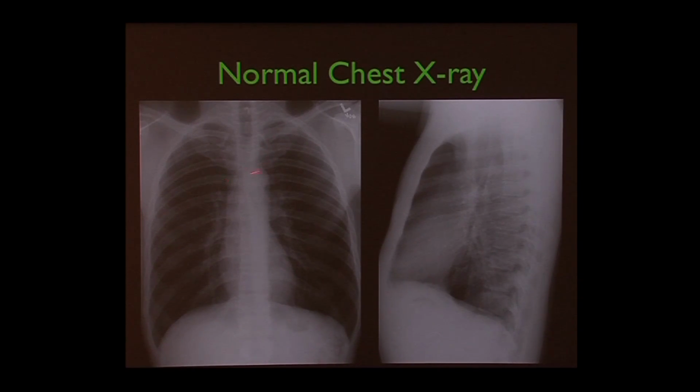We look at the mediastinum, where all the vessels go out of the heart and come back into the heart. Are there abnormalities there? We're looking at every single rib and the vertebra and the clavicles. And if they're included, I'm looking at the shoulders. This one was scanned and didn't get the shoulders, but I might see the shoulders. I'm looking at the abdomen below even though this is a chest x-ray. And this is the frontal view, and this is the lateral view. So the patient is looking, in this particular setting, to your left. And so we see the heart here, the diaphragm, the thoracic spine, and the lung.